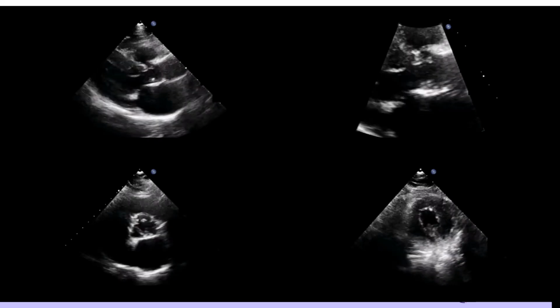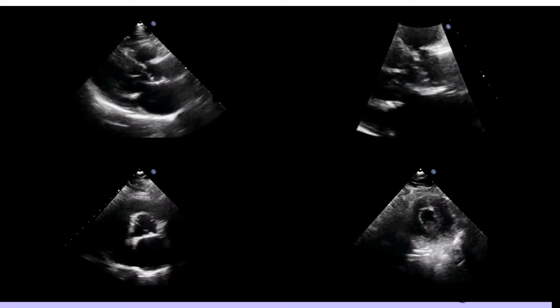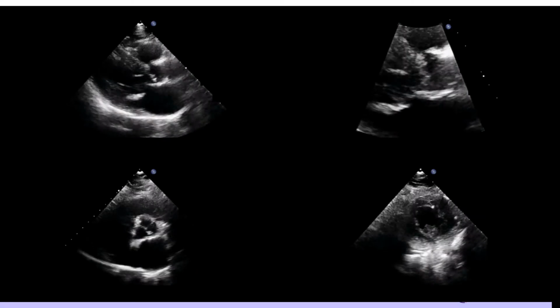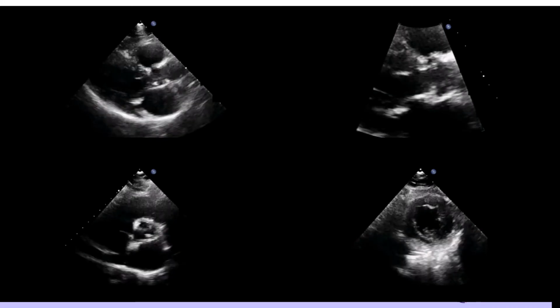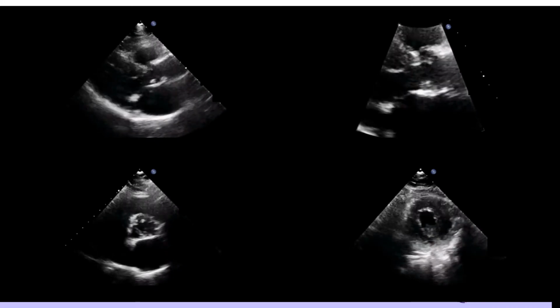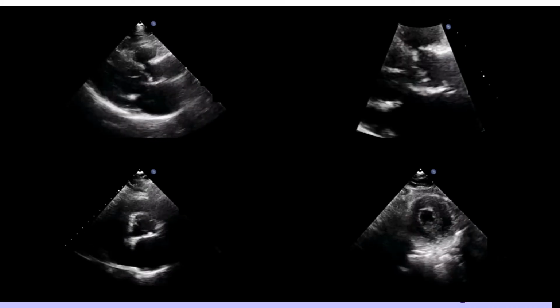No apparent regional wall motion abnormalities were identified. The aortic valve showed sclerotic changes. There was also mitral annular calcification.